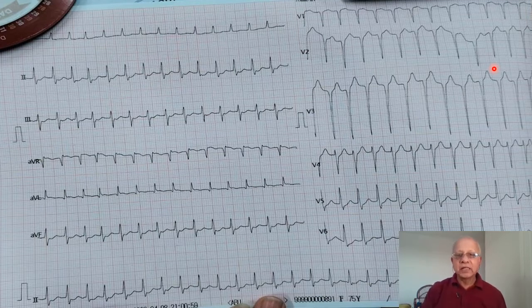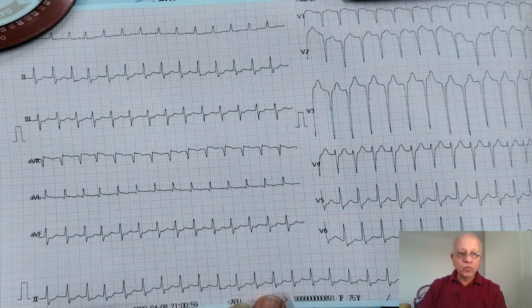So friends, here it was mainly a diagnosis. So I'm sure you would have made the diagnosis already. So we will go on to the discussion. So let us get on with the discussion of this ECG. What you see here is a classical narrow QRS tachycardia.